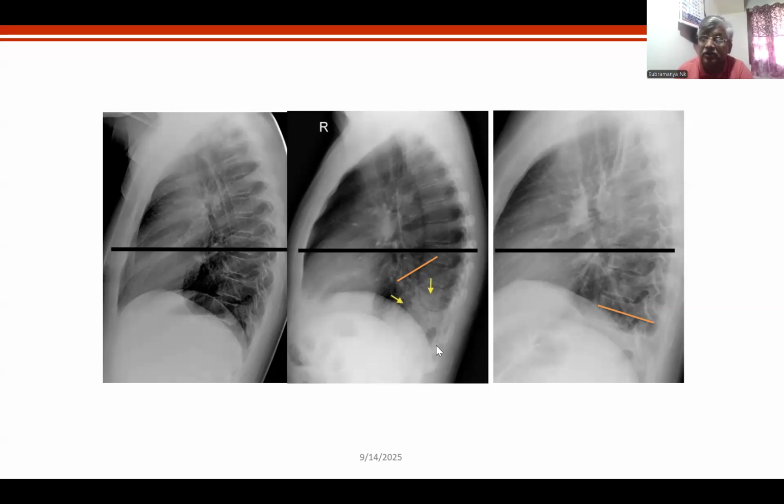This big pneumonia you will miss if you take an AP film. Or I would say sometimes, the lower half appears a little more dense than the upper half and you miss. This is the importance of the lateral. Please understand, suppose the child is not doing well despite a normal X-ray, you can consider the option of adding a lateral. I'll just show you the third lateral. Please focus from above downward.